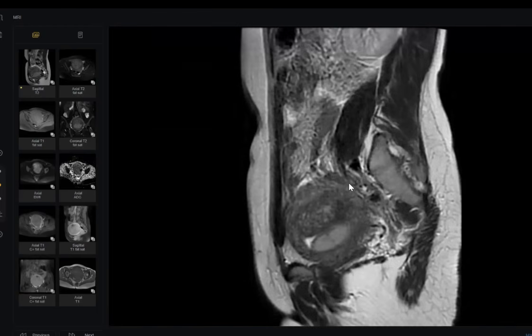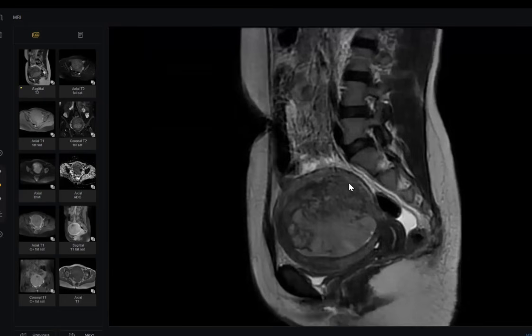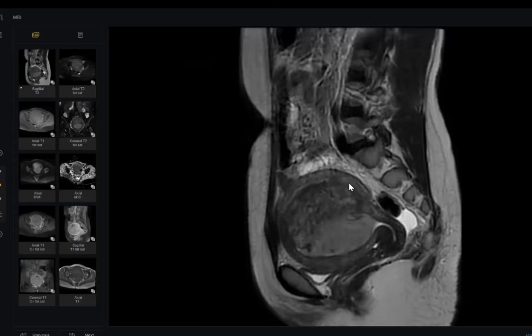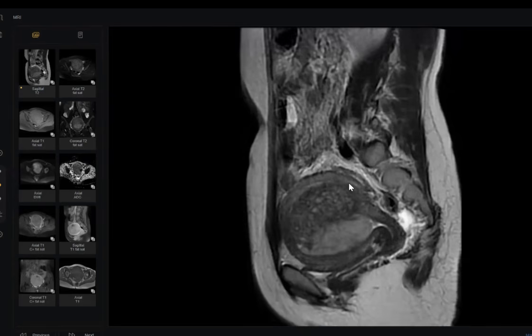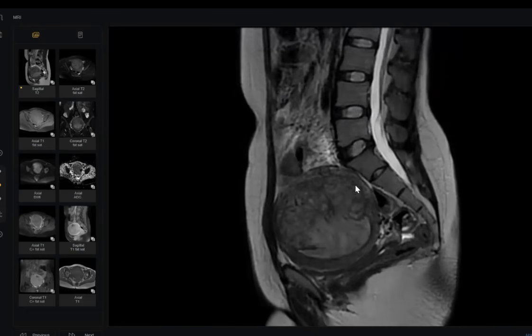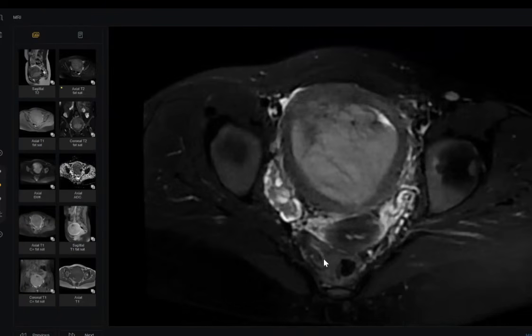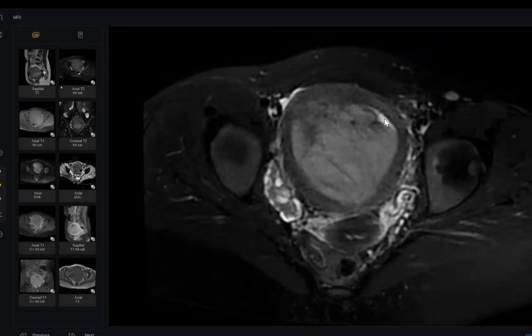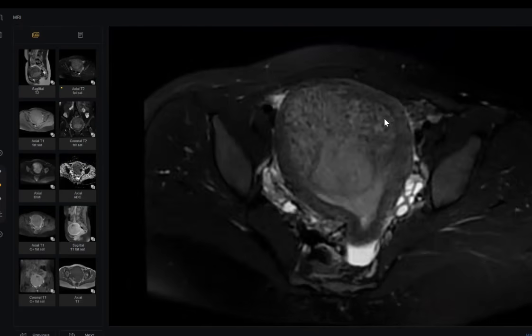And where is the endometrium itself? Could you pick it up? It was almost always invaded by the muscle, replaced by only this mass. See, it is replaced by this mass. And if you look here, there is some separation between the mass and the myometrium. And here also, correct? Yes, maybe a cleft of fluid. So last answer for you, last choice: is it endometrial or myometrial?